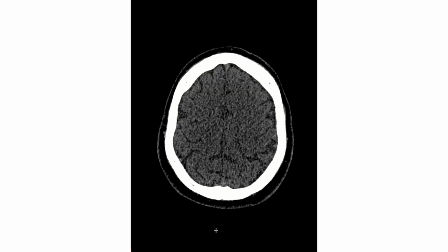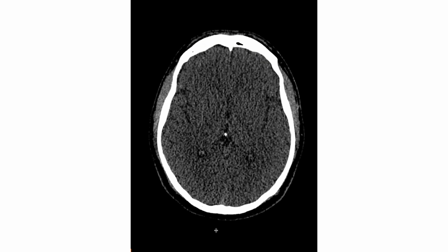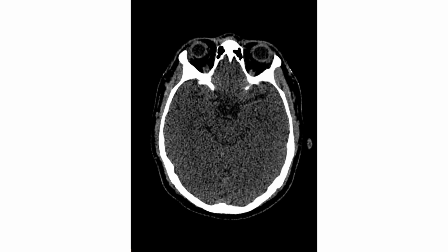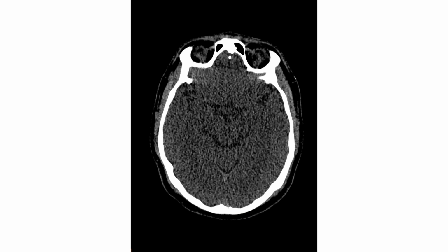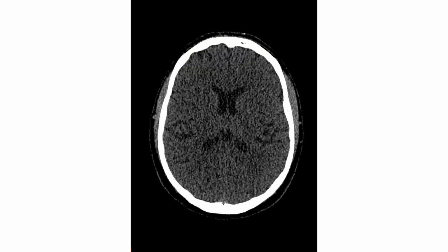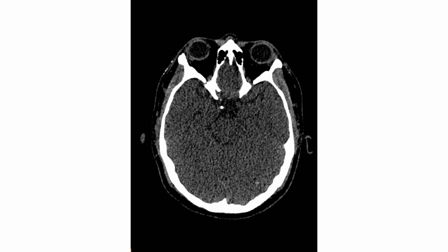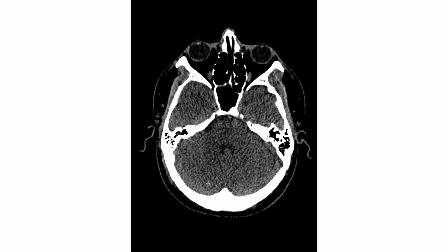You can go from outside in. So you just decide. So first of all, I always look at the dura. So this structure is a dura. Make sure you look at your dura very well. It depends on the age of the patient. Sometimes we have some dural calcification. Sometimes we have pathology like meningioma. As you guys see, I always look at this area very well. This is the area that when patients come with trauma, they can have hemorrhage. So basically I make sure that I look at my tentorium very well. These areas are called tentorial leaflets, make sure you look at the tentorium very well.